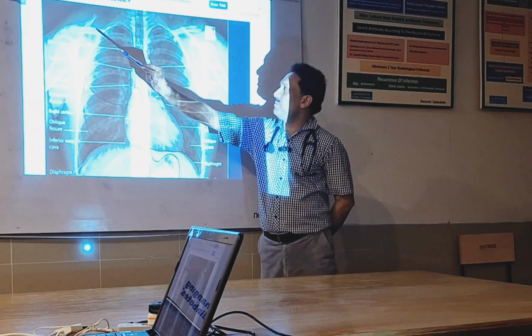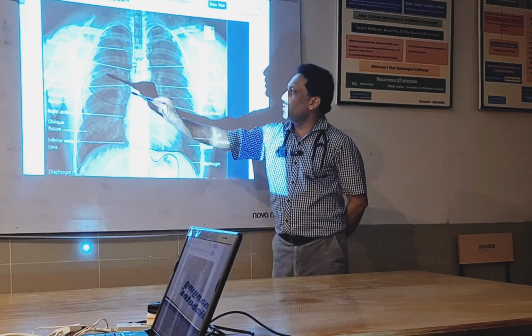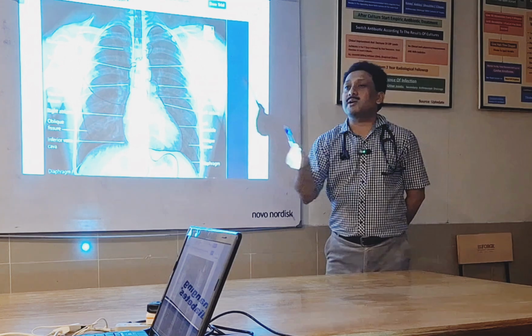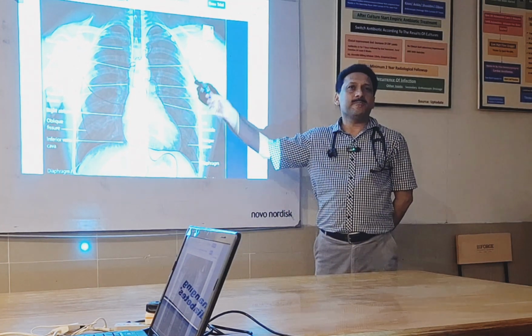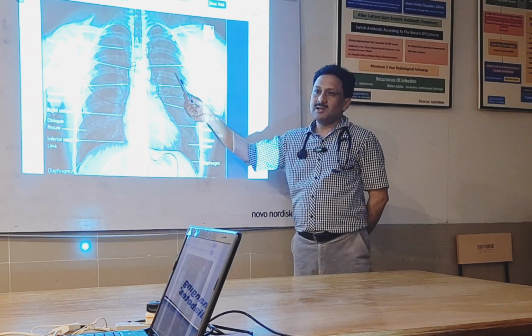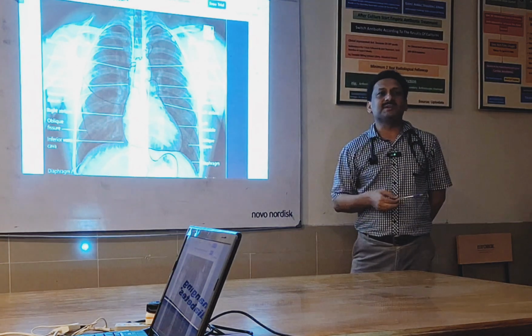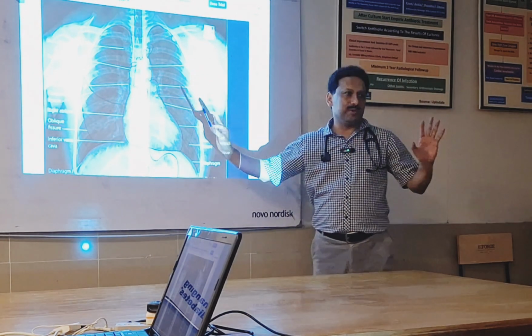B for bone. What you are supposed to look for in the bones are some lytic lesions. You are supposed to look for some indentation in the lower part of the bone, maybe secondary to coarctation of aorta. There might be some fracture here. So these are sort of findings. There might be some osteoblastic lesions. A bone may become too white, a single bone, as it is taking up some signals due to maybe some underlying malignancy. So you would be seeing these bones.